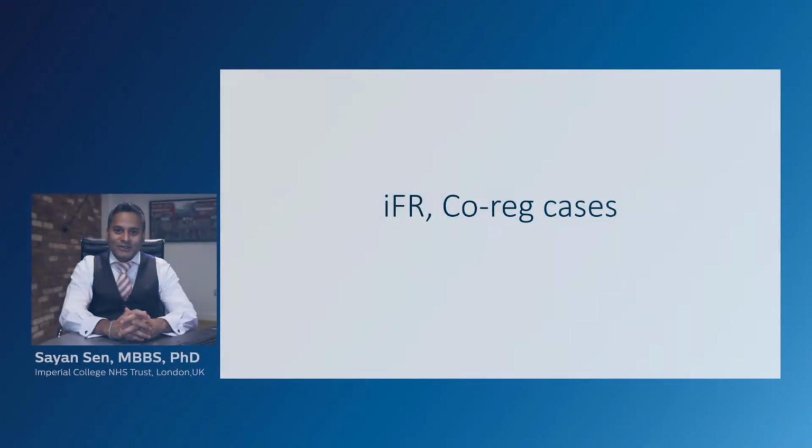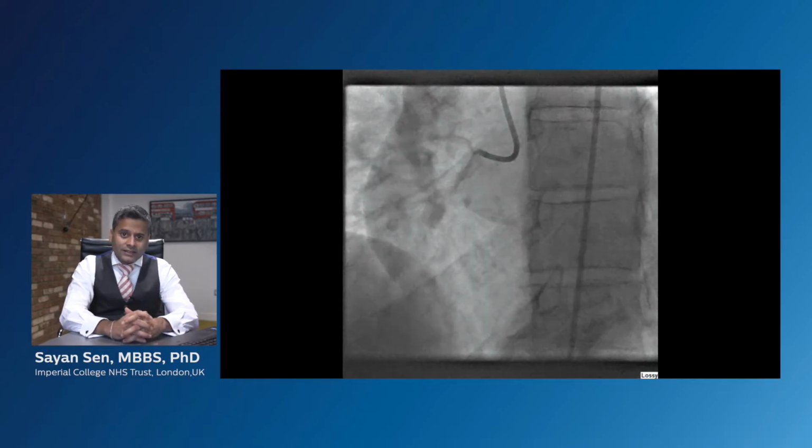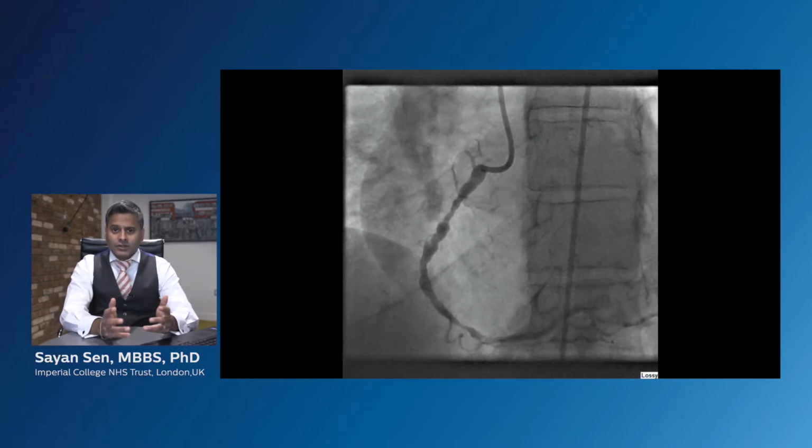I'd like to share a few cases where iFR co-registration has changed my practice. The first case is of a 65-year-old gentleman with exertional chest pain and a positive exercise test. He had a coronary angiogram, which is highlighted here. The left system was unobstructed.